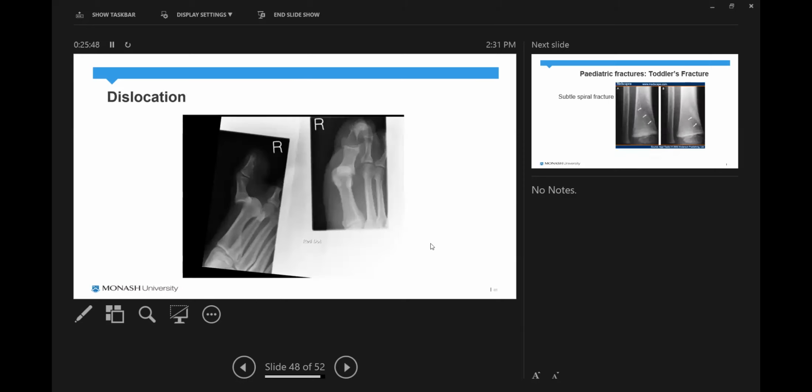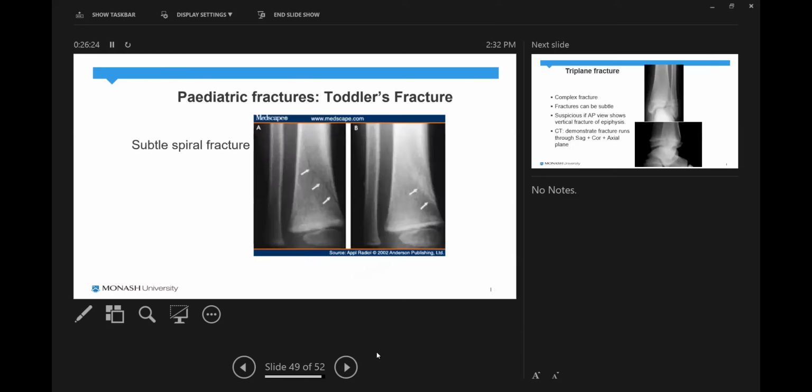It's important when X-rays are taken that there is a true lateral view. So if we first focus on the AP view of the big toe, you immediately pick up there's definitely something going on in the joint. So between the metatarsophalangeal joint, the first one, the proximal, you can see there is something going on. But on the lateral view, you can clearly see that this is a true dislocation. So it's important that true lateral views are taken of any of the digits.